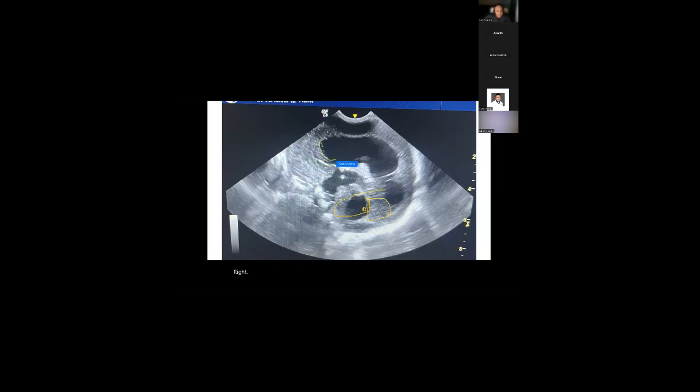That is the midline, because I can definitely see corpus callosum here. And again, you can see this area of leukomalacia right at the top. So yes, dilated ventricle, and I suspect this is the midline because you can see the third ventricle with clot in between. Well done. It's never easy. I really struggle with this when there's hydrocephalus. So, with my compliments.